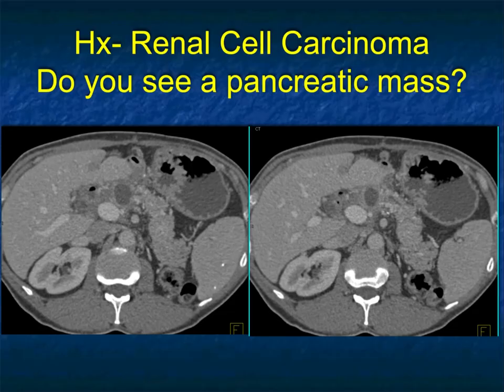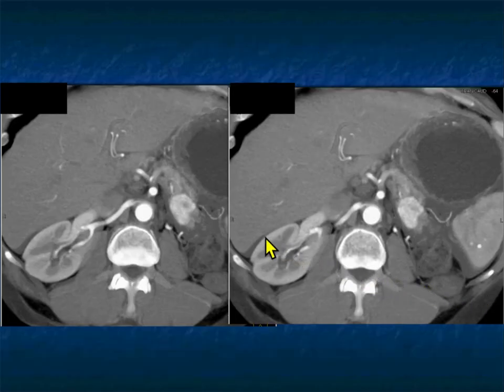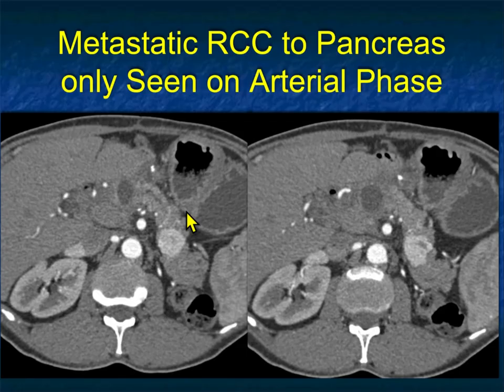Another example would be in patients with renal cell carcinoma, you're restaging. Now, sometimes people just say get a venous phase imaging. Well, renal cells, particularly clear cells, when they metastasize, and they can metastasize 10 or 15 years later, they're typically very vascular. So if you look at this case in a patient with left nephrectomy, you look at the patient's pancreas, it looks fine. It's falling down into the renal fossa. But once you gave IV contrast in the arterial phase, look how obvious that lesion is. You missed a 3 centimeter mass.